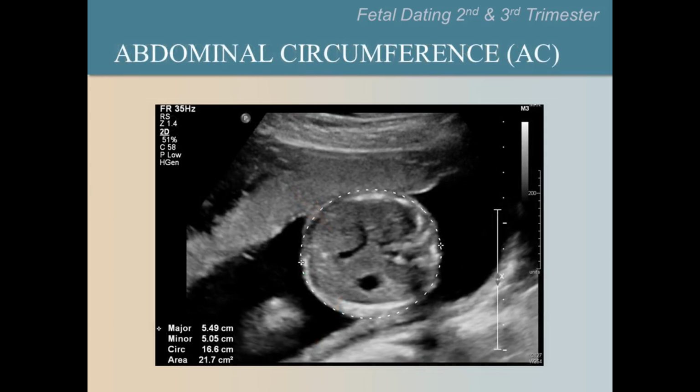The abdomen is the next structure to measure to determine gestational age. Please pause the video now to ask your trainer to show on a doll the level of the cross-section to image for estimating gestational age. Then identify the important landmarks in this image which you need to see to measure the abdominal circumference.